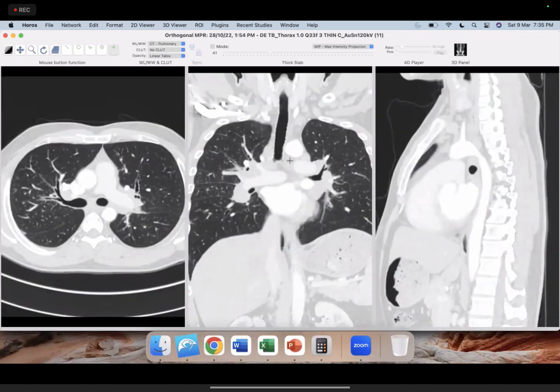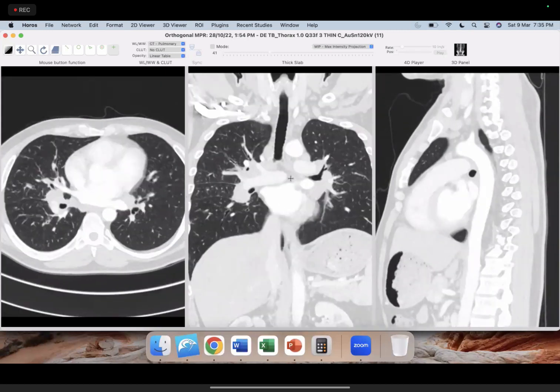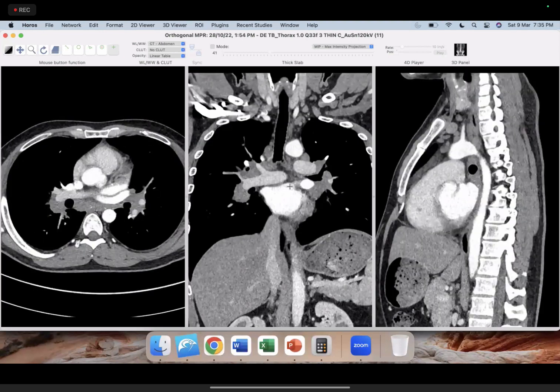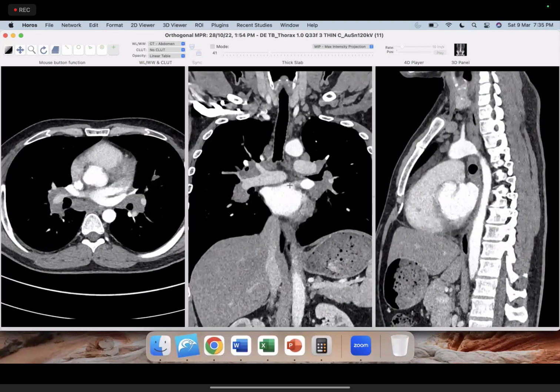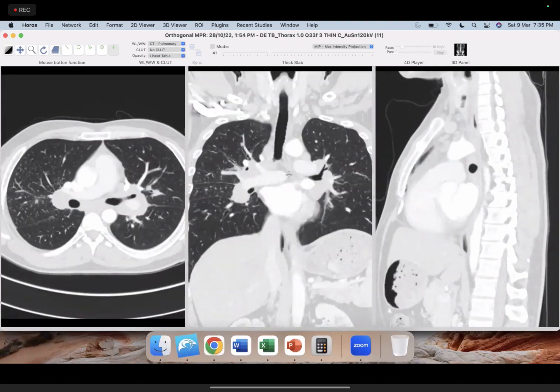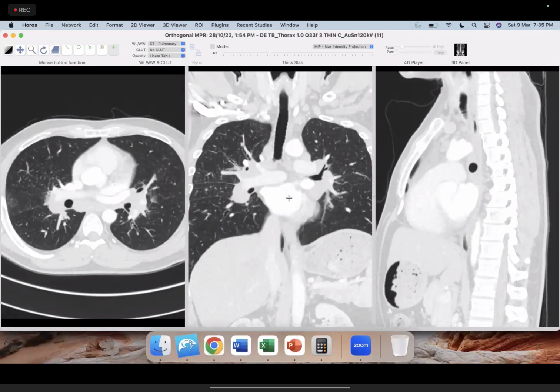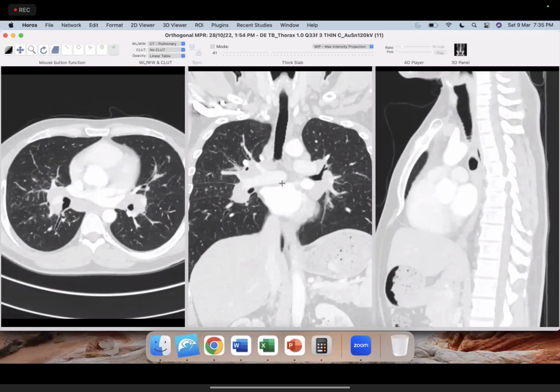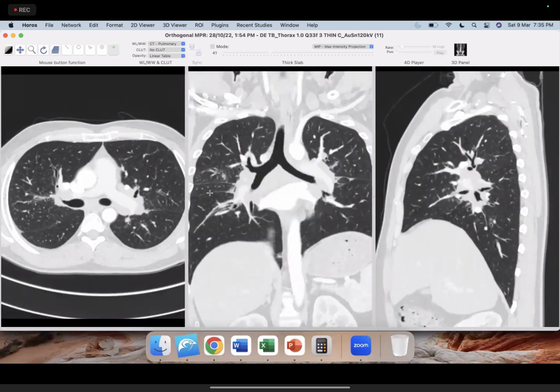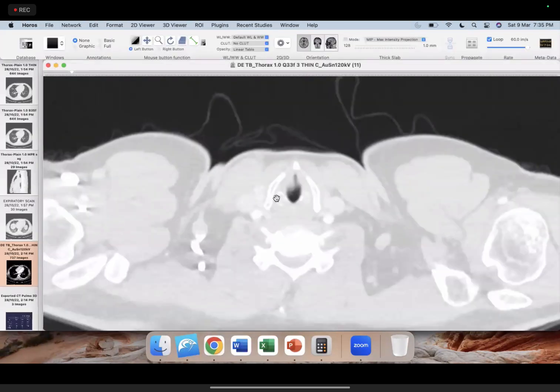And for this, again, try to analyze the nodules, because once you have non-necrotic lymph nodes, it doesn't help you to differentiate between tuberculosis and sarcoidosis. The only way is based on the lung lesions. And many times, if you are still confused with calling this tree-in-bud or bronchocentric, you will make a wrong diagnosis of tuberculosis. So this perilymphatic distribution is also not so difficult. The moment you see a few of the cases, you should be able to make this diagnosis accurately.